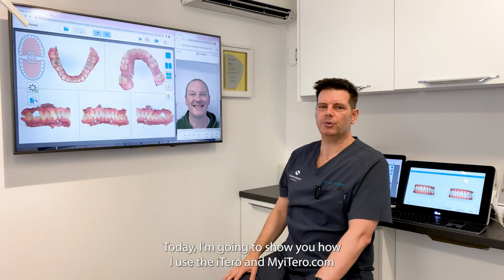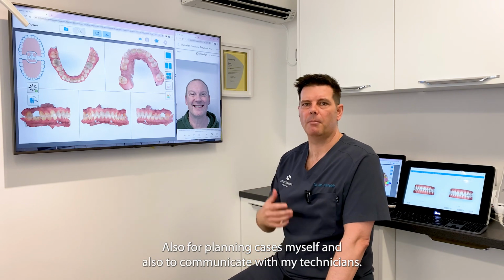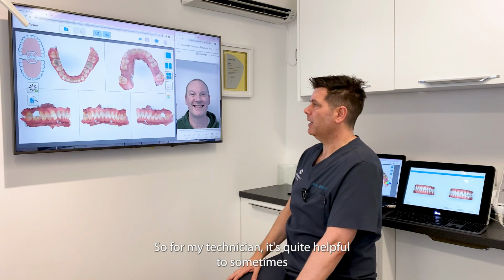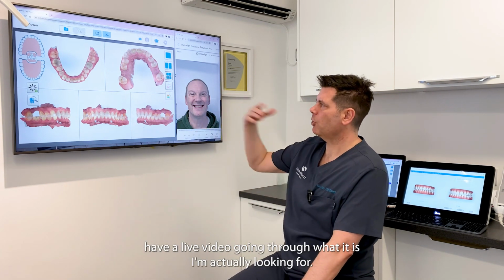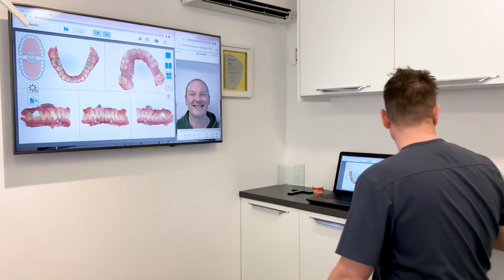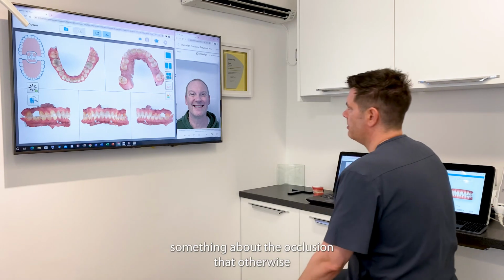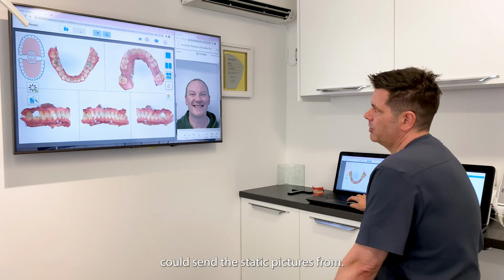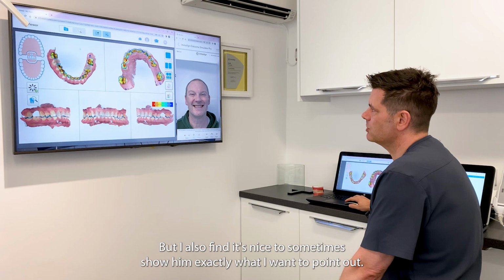Today I'm going to show you how I use the iTero and myitero.com, both for planning cases myself and also to communicate with my technicians. For my technician, it's quite helpful to sometimes have a live walkthrough of what it is I'm actually looking for. In this case, we might want to tell the technician something about the occlusion that I otherwise could send static pictures of. That's fine, but I also find it's nice to sometimes show him exactly what I want to point out.